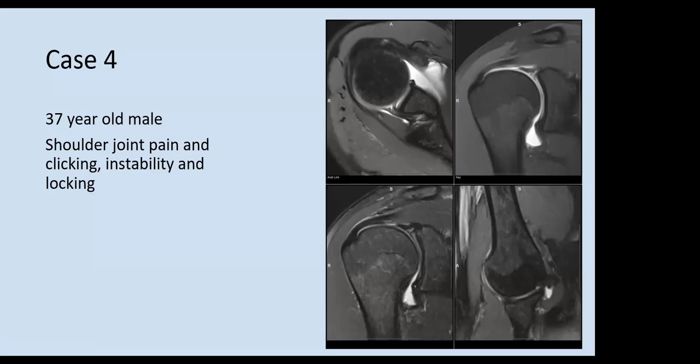I can see that there is an arthrogram in the axillary pouch as well. If we talk about the coronal image, I can see a fluid signal in the inferior glenoid labrum, at 6 o'clock maybe. Okay, so this is coronal T2 fat saturated, and this is coronal T1 fat saturated. Do you see this signal on the coronal T1? No, actually not. So let's leave this one, because this is actually not gadolinium; here we would have seen it.